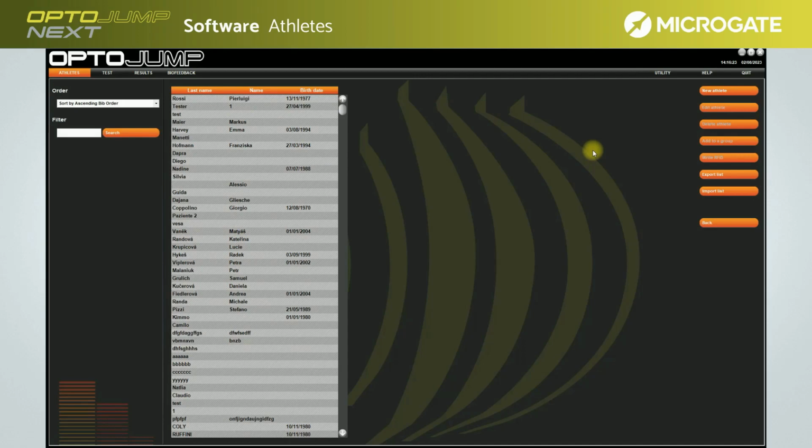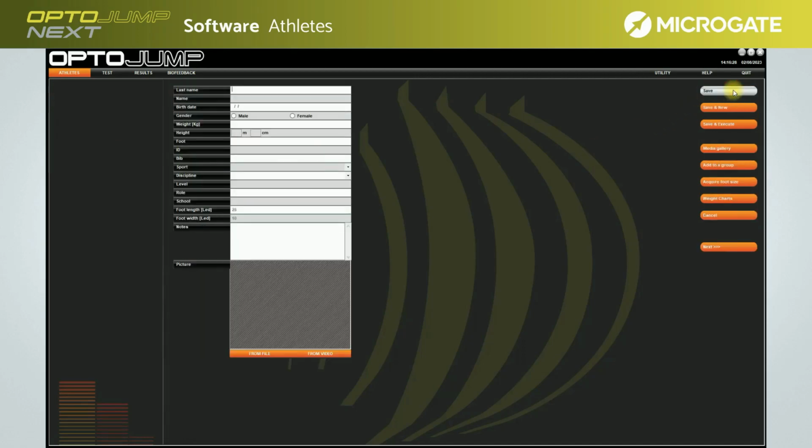There are two ways to enter them. The first is via the New Athletes button on the right side of the window. This selection will open a view with the athlete's data to be entered. In addition to first name, surname, date of birth, and gender, you can also enter other data of possible interest, such as height, weight, sport, discipline, and many others. If the athlete's weight is entered, this is used for the calculation of total energy and power and is historicized.